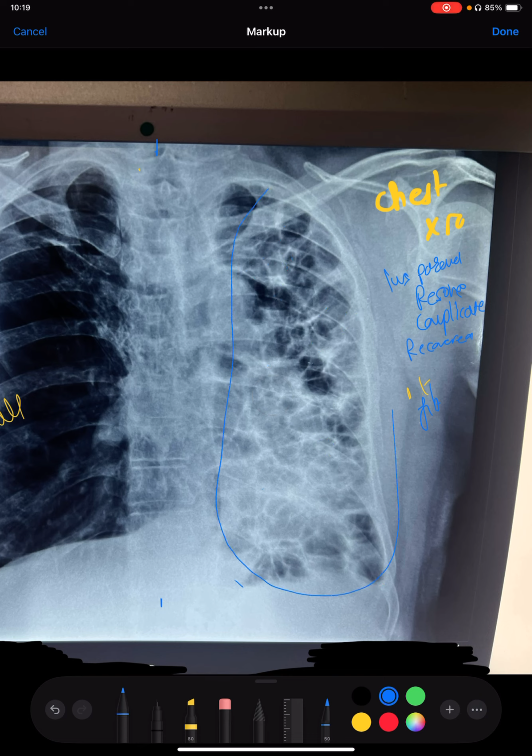From here to here, there are so many fibrotic, thick, white streaks present all over the lung, which simply causes fibrosis. So, if the lung was like this, because of the fibrosis, the lung gets shrunken, the lung gets small, the lungs get fibrotic, and that is what a restrictive lung disease is, where there is restriction to lung expansion. So the lung cannot inflate because it is significantly damaged.